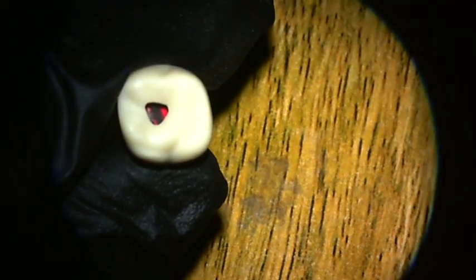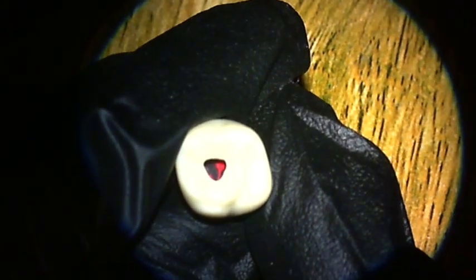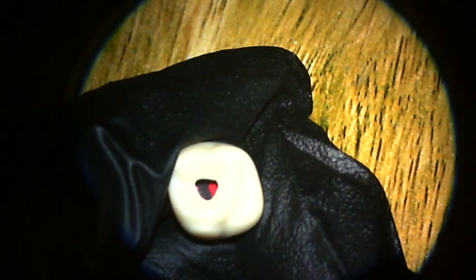Flare of preparation. So what does that mean? It means that when you're looking from an occlusal view, you can see the internal walls. That means you have over-flared the internal walls, and that is considered an over-reduction. The only instance that you should be able to see the walls is when you tilt the mirror and see the walls.